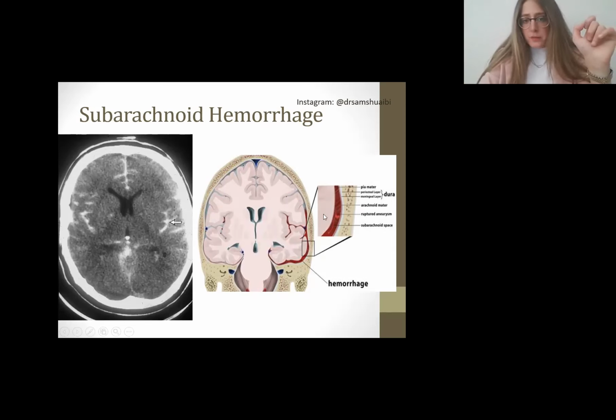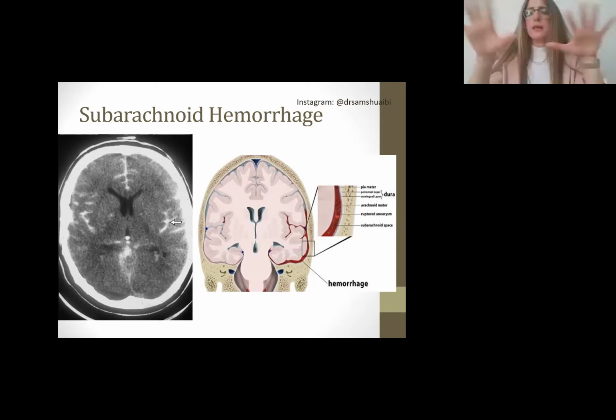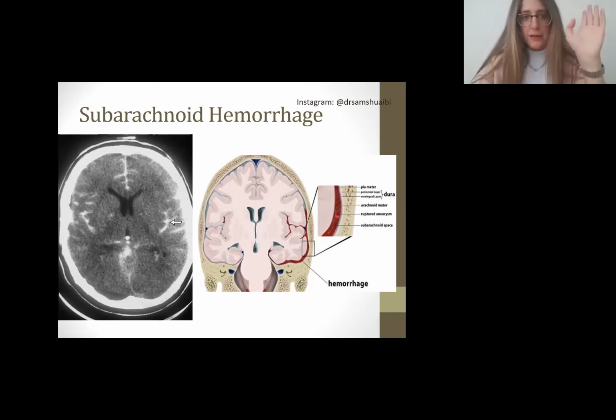Okay. So there's bleeding into the cistern, right into it. So it's going into it. Okay. And this is what you expect in subarachnoid hemorrhage. Extremely different from the epidural and the subdural, which is crescent moon shaped, which gives me Ramadan vibes.